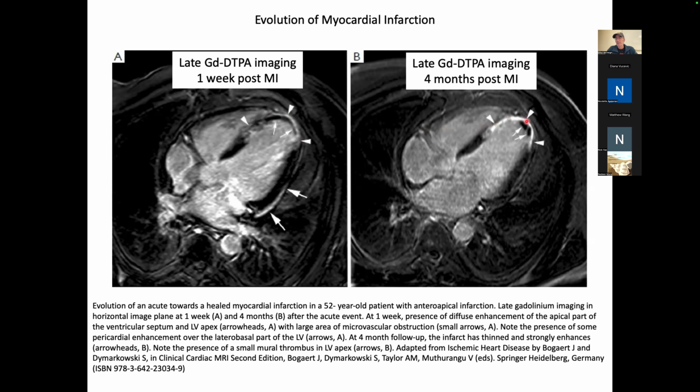The wall has sort of consolidated that infarct and it's become thinner. There's now either normal myocardium on the endocardial side, or again, this can be hemodynamically challenged tissue that still really isn't allowing any contrast to go in there. And this is the stable configuration now of this tissue, and it is going to look like this for a long time. What's probably going to happen is the tissue will get thinner and it'll get stiffer, and then a year from now, it can possibly start to balloon out as a kind of aneurysmal thing.